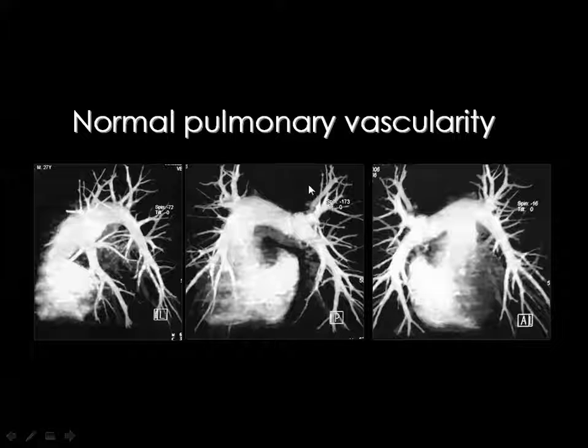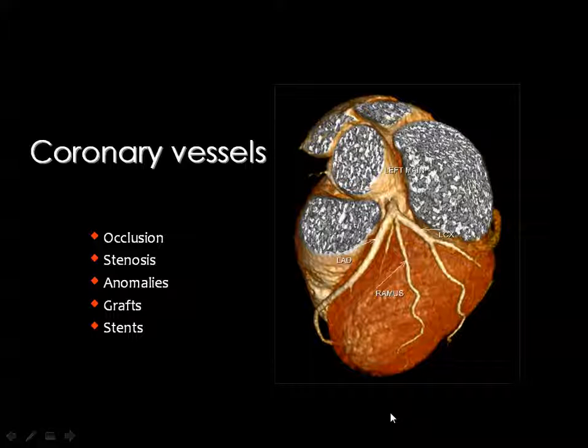Also here you have the ability to subtract from the image any of the anatomic or pathologic structures. As you can see here, we have removed the chest wall, the ribs, the spine, and the lung fields as well. We are left with the pulmonary vessels, and we can rotate the image to see every branch not overlapped with other branches.